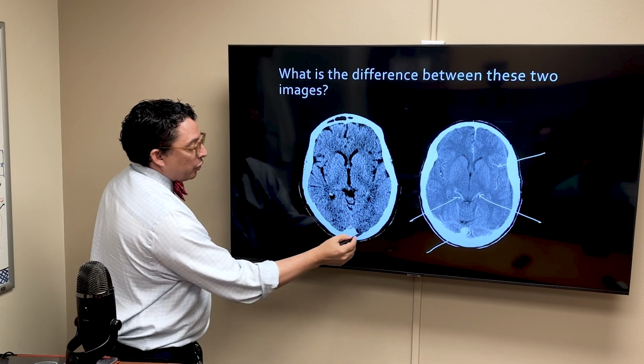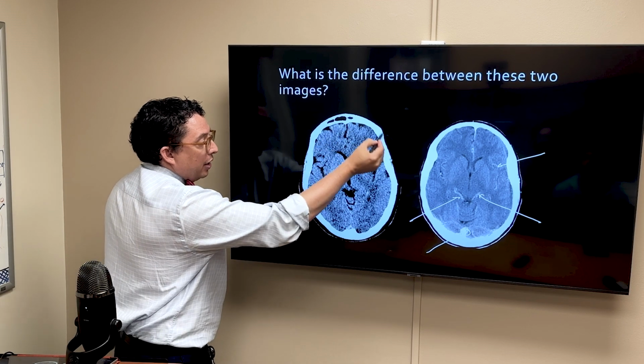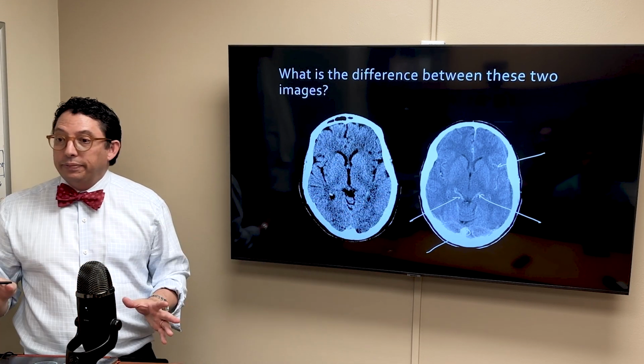Remember, the skull is seen as hyperdense or white. Very important.